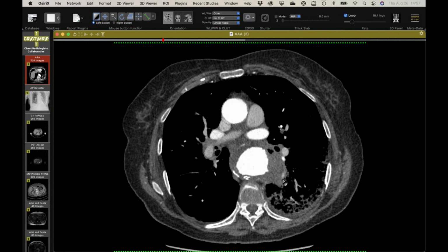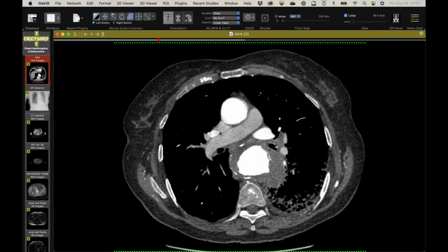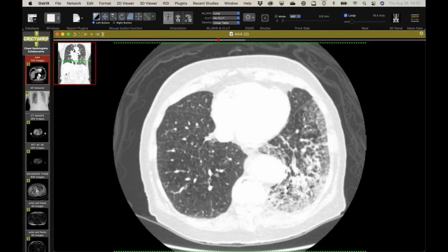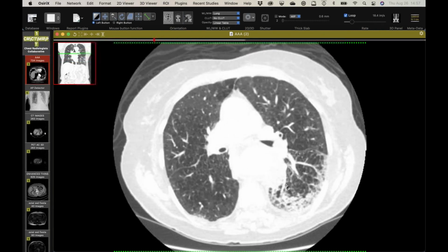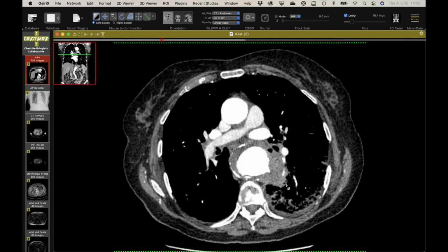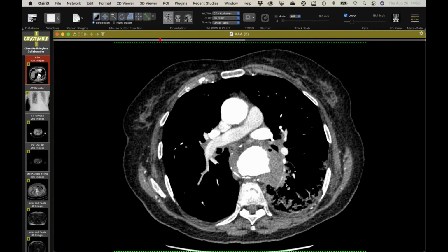the lung. That looks like a ruptured aorta to me, Jeff. Yeah, on the left side. And what's going on in the lung? Yeah, that's all the blood. I mean, clearly leaked. They presented with hemoptysis, and it was billed as a lung mass causing hemoptysis, which just didn't fit. Didn't look like it. So we went down the aortic route.